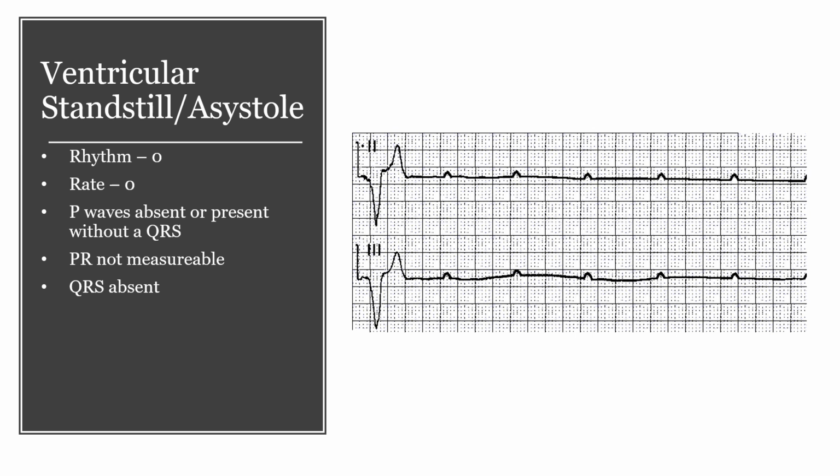You do not shock ventricular standstill or asystole. It is like trying to start a car with a dead battery. So we're going to continue CPR, and we are trying to find out what could be causing this. They are going to administer medications to help try to restart the heart, but with asystole, it is not defibrillation.